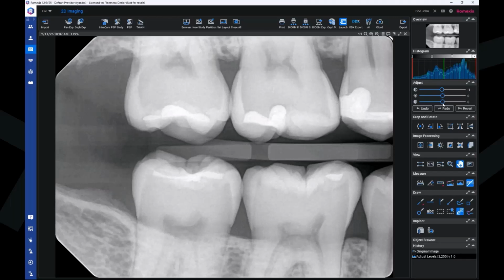You can adjust it to your wishes and needs, and then those adjustments can be saved as default processings. This is very important to know and to do, so that it will save you time later on when you capture the same image type.